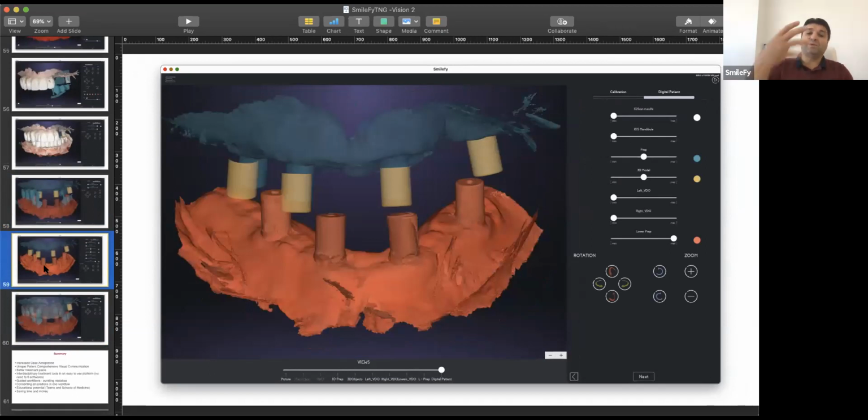and then on top you can create your design for your denture. And with the 3D smile frame that we have, the denture creation is super easy, because then you decide the occlusal curve and everything else is calculated automatically. Upper and lower design is calculated automatically based on your occlusal curve. There is no distortion. You just decide the occlusal curve and we create the dentures. The only thing that is missing is to create gums, but that's something that we're going to work on, and then we're going to make a small update, and then you get also the gums.